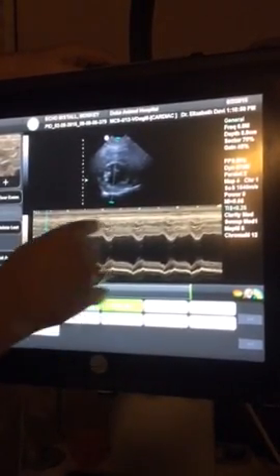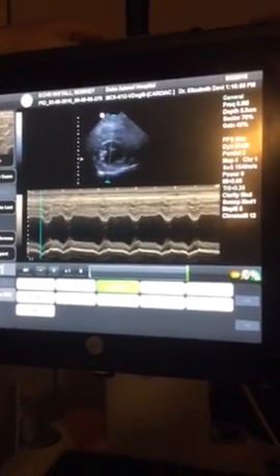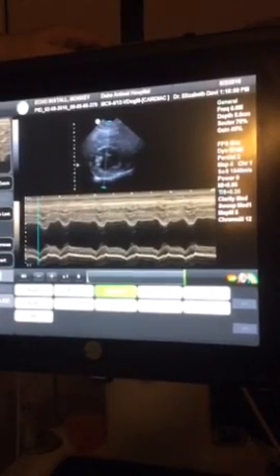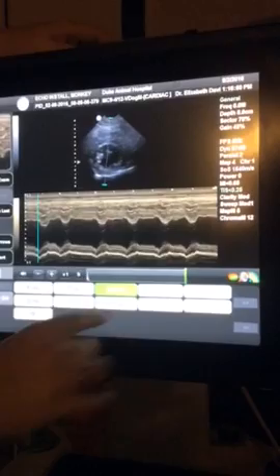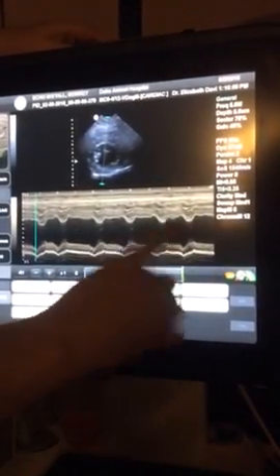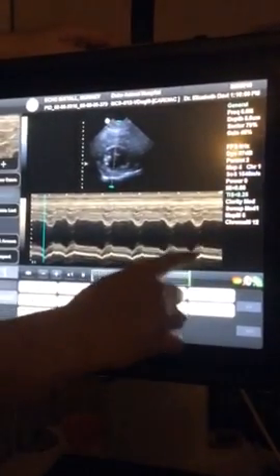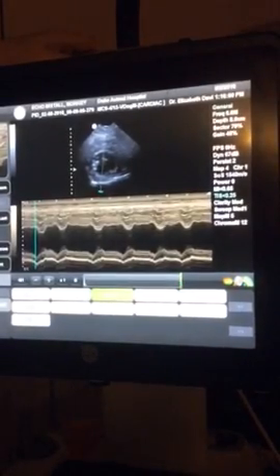Even if you measured the same one here, your algorithm's just calculating for minor caliper position changes. So even if you measured the same cycle 3 times, the information relatively shouldn't change that much. We talked about that EF. As long as your EF doesn't drop greater than 10% either way, you're always okay with your measurement. In other words, we don't want an EF that's 60 and then we measure it again and it dropped to 40, or 60 to 80.